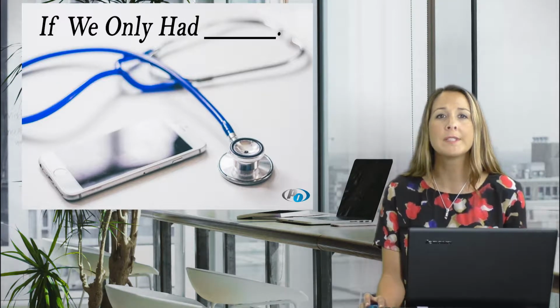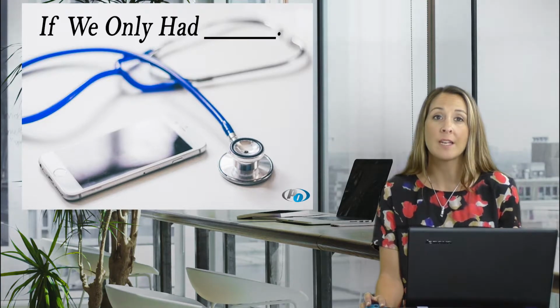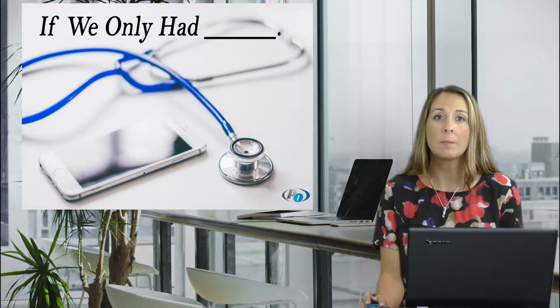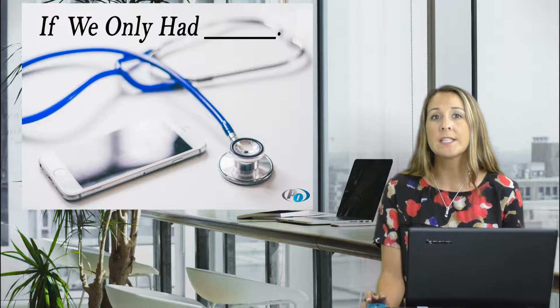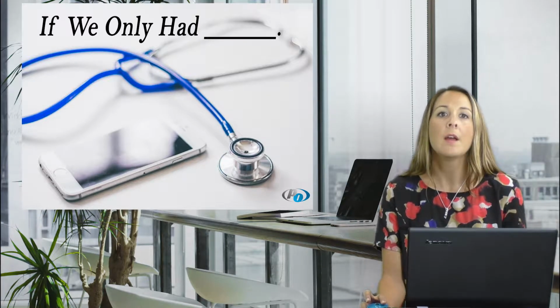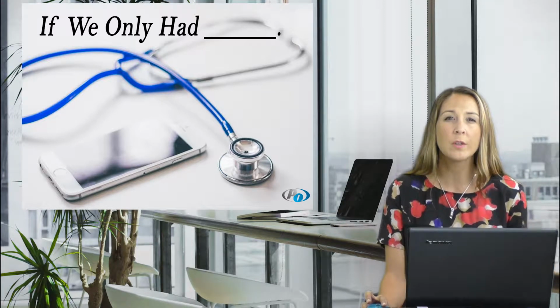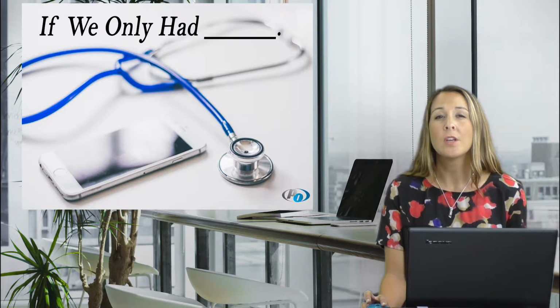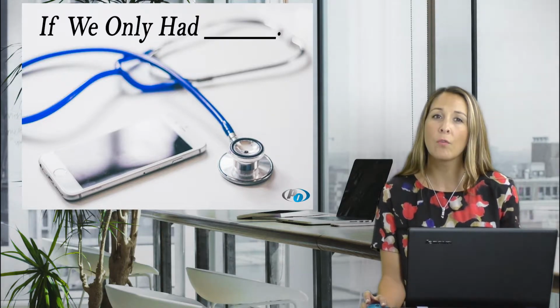So clinical movement data, one of the strengths of it is really that it has a patient database and it allows for high definition streaming of a video in both planes, the coronal and the sagittal. So you can see both views, they're already synced together and you don't have to sync them or anything. The other great thing is that they create really sophisticated, nice looking reports with two different interventions side by side compared. So we're going to go over that all today with clinical movement data.